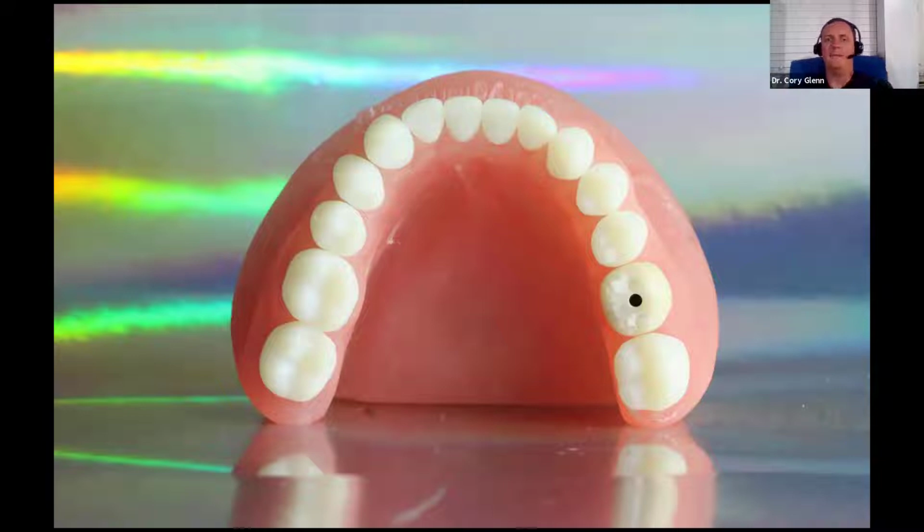And once again, you see it's just a simple crown that you can bond onto the tie base. This is a feature for those of you who are doing implants. This is a feature you might want to use, not necessarily for restorations, but think custom healing abutments. So you could simply do that design, and if you want to create a molar emergence on an implant that you've placed, you could just design the crown to full contour and then simply grind the occlusion down. And now you have a custom temporary. And if the tissue heals to that exact shape, then you can just go and print or mill again the same shape. This time, just don't grind the occlusion off. And now you have your final restoration. So it can really streamline your workflow.